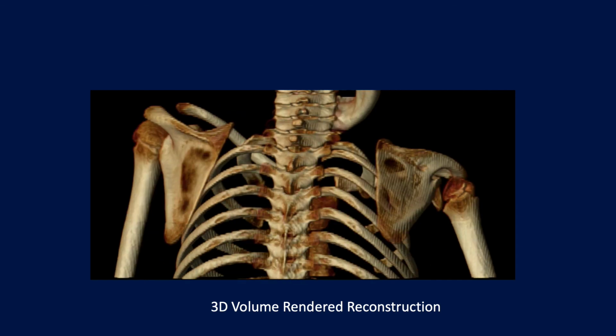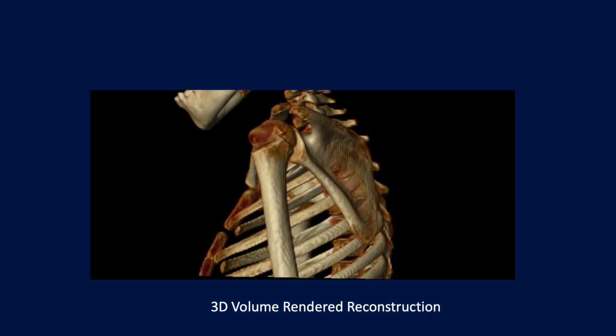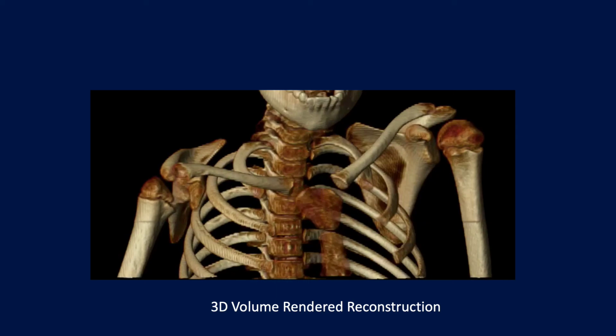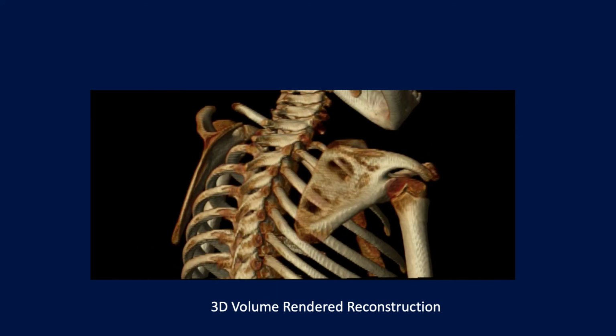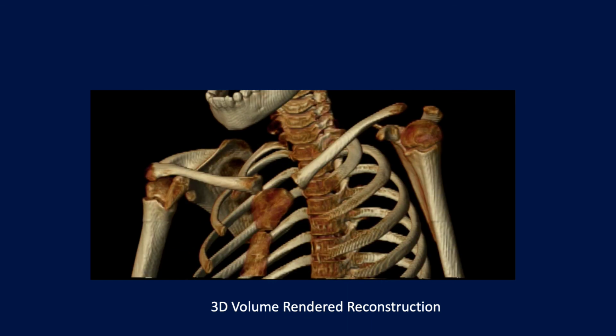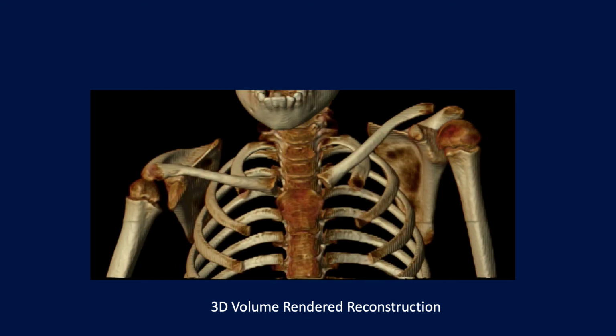Our surgeons also greatly appreciate a 3D volume rendered reconstruction of the shoulders using the same data set as demonstrated here. Again, demonstrating the degree of glenohumeral dysplasia and abnormality to both the glenoid and the humeral head.